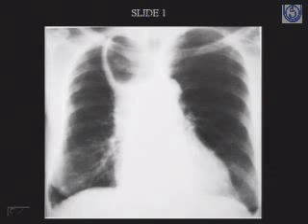The mediastinal contours appear to be widened. The right border of the heart, or the right margin of the mediastinum, appears to be widened, and the imaged thoracic cage, the clavicles and the ribs appear grossly normal.